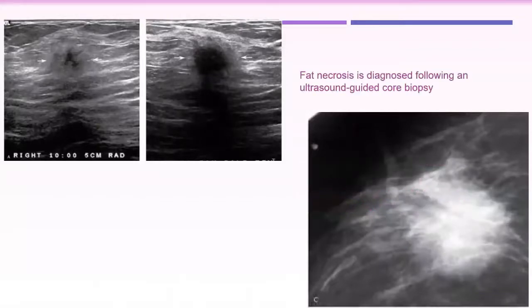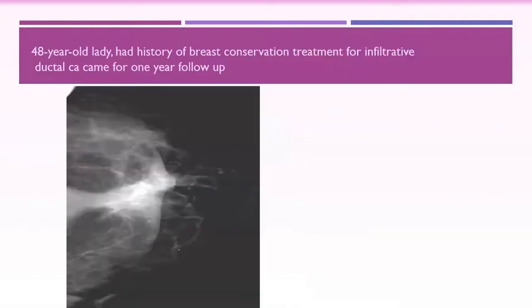Okay, and proven by ultrasound. They had done ultrasound and they found fat necrosis, and they followed the patient. The patient came on the follow-up with the lesion almost completely resolved. Okay, this is our patient. You have seen it before.